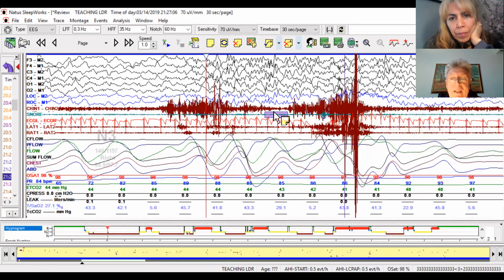So, yes, but it goes below the double of that, much before your mark. We are, of course, in a very borderline situation, but I would have scored as 2 separate movements.